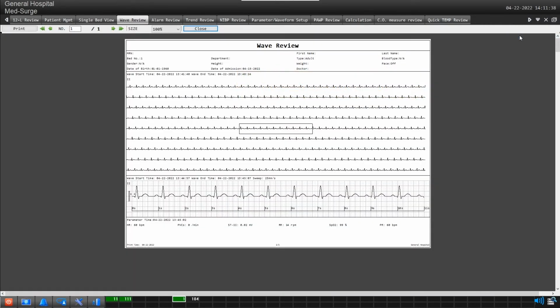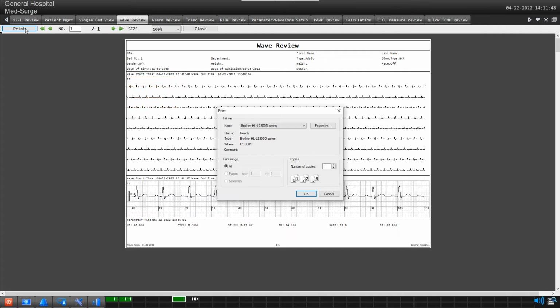Now, click on Print Current 1 segment. You will now see a preview of the soon-to-be printed document. If everything looks good, click on the Print button located here. You will now see a printer selection menu appear. Choose your printer, or choose Microsoft Print to PDF if you prefer electronic documents. You will still have to choose a PDF file name and destination.